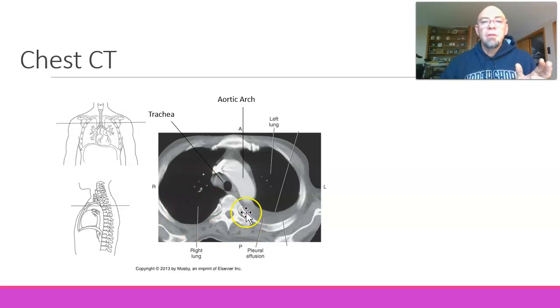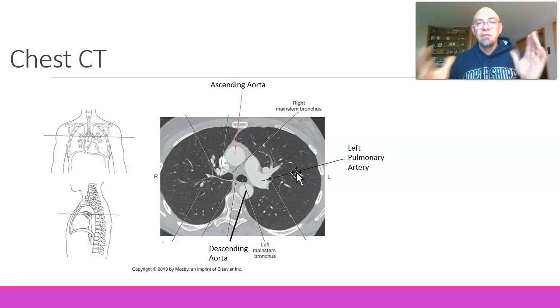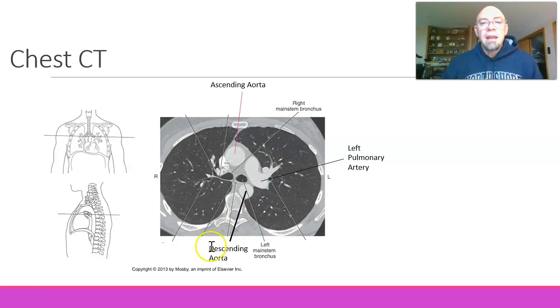So just an example, I'm not sure which window level this is. You can see we've got some pretty good detail of the bone, although the detail of the bone is pretty good in the other image too. But this is certainly pulling out that lung tissue. So just an example of how your window level can really accentuate certain anatomy.